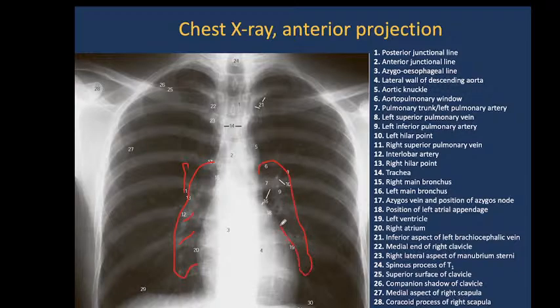As I think you guess, those are bronchi and large vessels, pulmonary veins and arteries coming into the lungs through the lung radices.